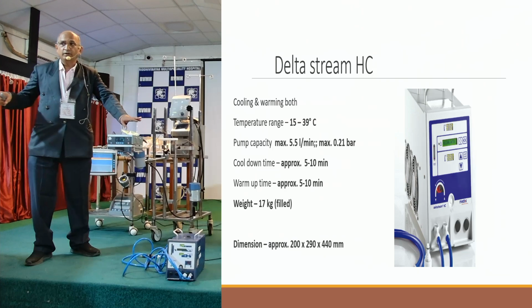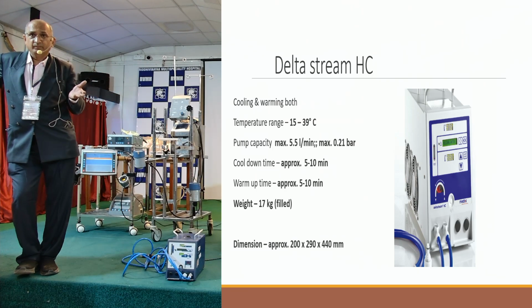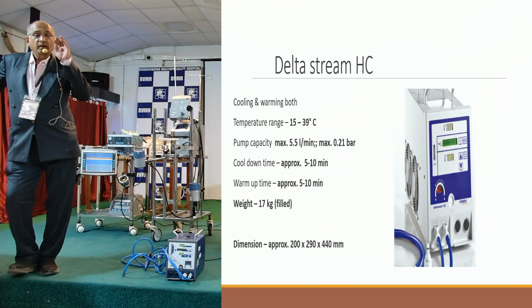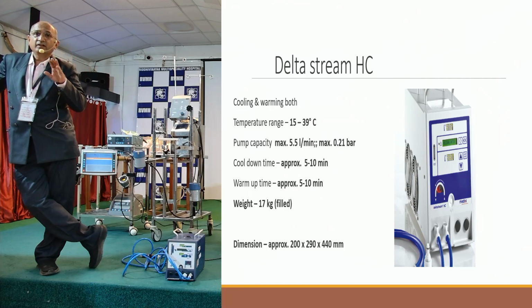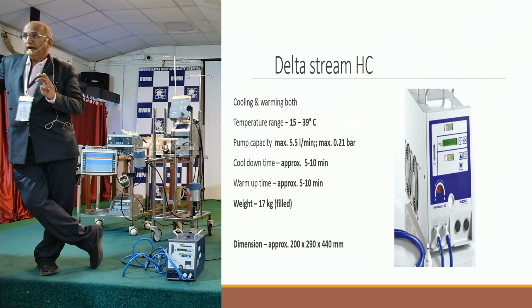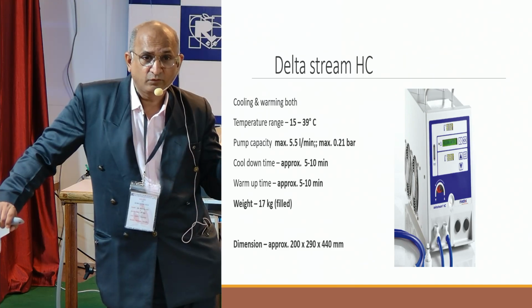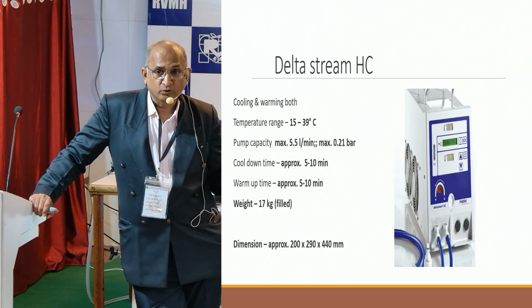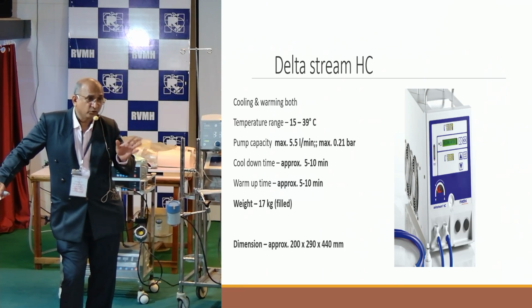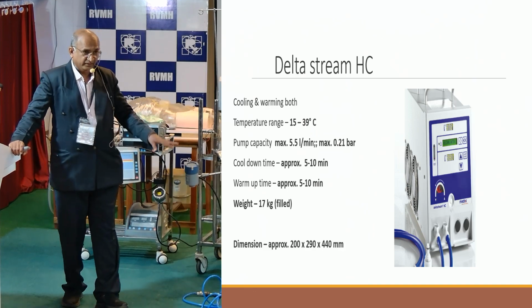Okay, heat exchange unit. Usually in ECMO you require only a heater unit. You don't require a cooler. In case of bypass, you require heating and cooling both. The only places where you require a cooler is when you are doing ECPR, for therapeutic hypothermia, and if the patient is persistently hypoxic and you need to treat it, and there are no other ways, you induce some hypothermia to improve the saturation. So these are the two places where you need to use the cooler unit. Otherwise, you just require heater units.